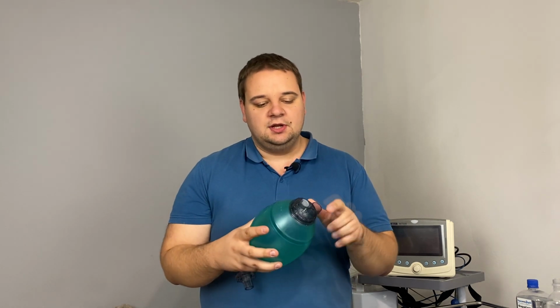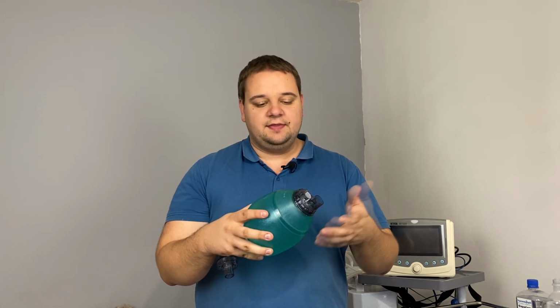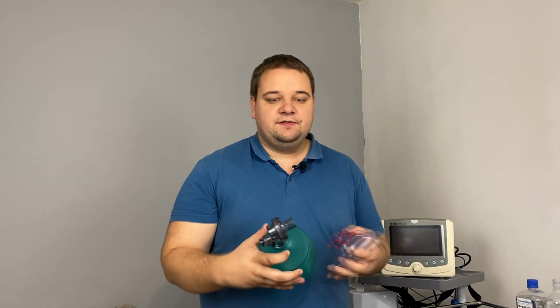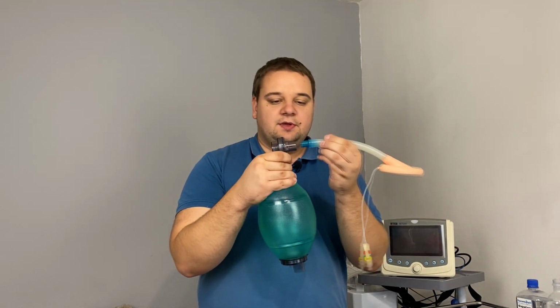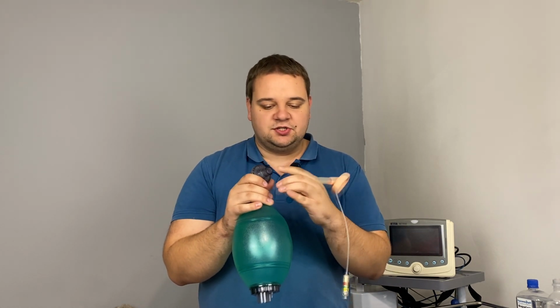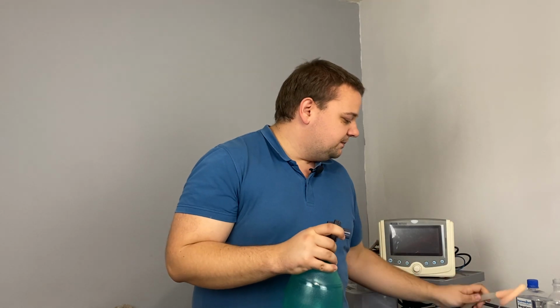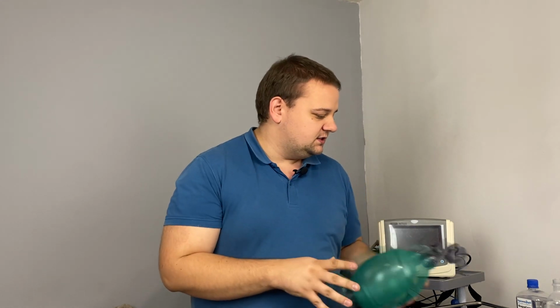If we want to give additional oxygen, we can use the O2 tube here, and in this case it will mix the air and oxygen together and create some enriched mixture. And the connector is universal, so we can easily connect it to the face mask, or we can easily connect that to any type of the airway management tube. They are all the same. There are no special curves, special maneuvers for that. You just press it and it's done. And we can also use machines for ventilation. They also use the same connectors, but the machines are a different story. We should not talk about that.